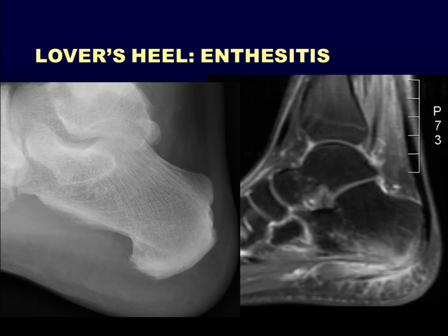That same enthesitis can be seen just about anywhere in the body where the tendons attach. Here we see a really pronounced amount of enthesiopathy where the long plantar ligament, and again, less impressively, where the plantar fascia attaches on the heel, maybe a little bit where the Achilles had some issues. We commonly see enthesiopathy here, but we currently have a ton of active inflammation at both the plantar fascia and long plantar ligament attachments on the heel, creating marrow edema-like signal.